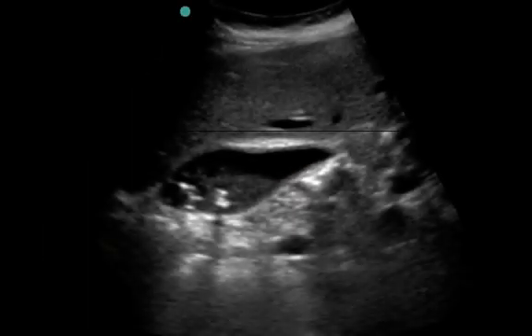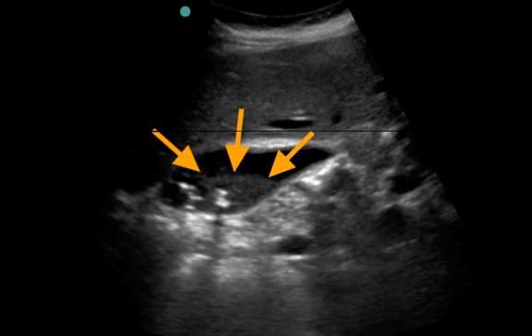This fourth ultrasound study is indicative of biliary sludge. Gallbladder sludge is likely made up of very small stones, making the bile viscous and giving the bile echogenicity. The sludge is identified on ultrasound as a dependent layer of variable, non-shadowing echogenic material forming a meniscus within the gallbladder lumen. Frequently detected in states associated with biliary stasis, such as limited PO intake, sludge may be a precursor to gallstones and has also been related to pathology such as acute cholecystitis and acute pancreatitis.